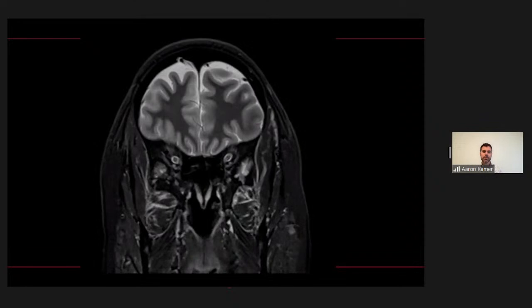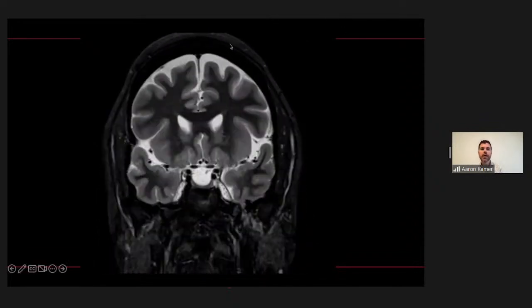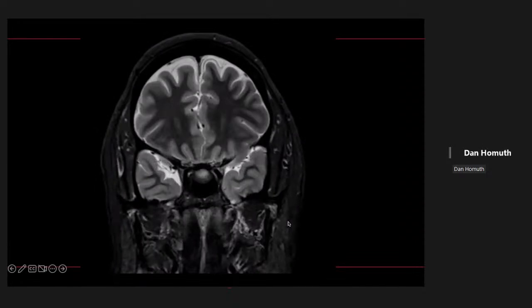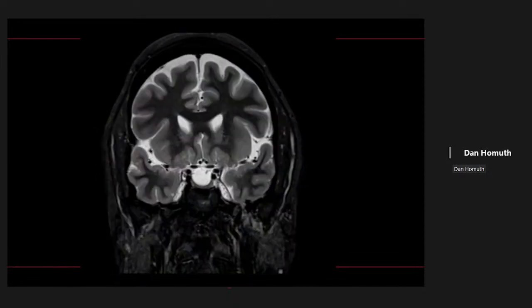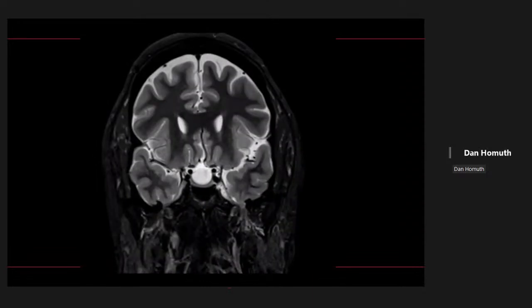All right, I think we have time for one or two more cases. In fact, this is one of my favorite diagnoses, and I'm going to ask Dan if you can talk about this here. Sure. So we have a coronal T2 weighted image. Just scrolling through the. What's the most conspicuous?